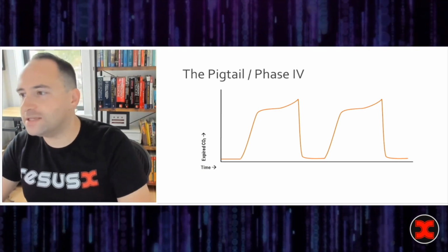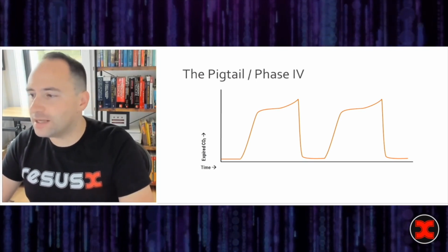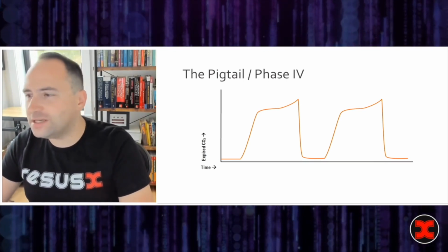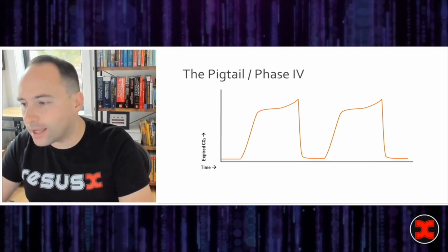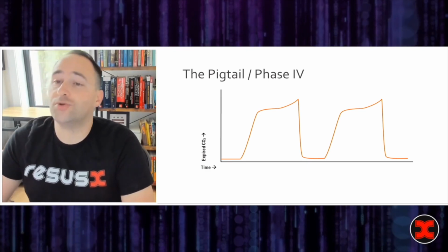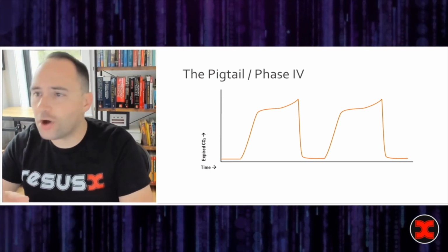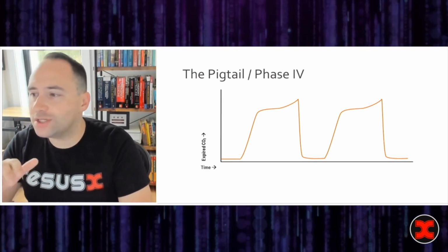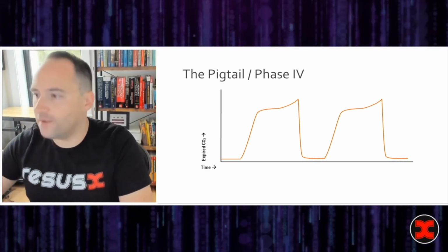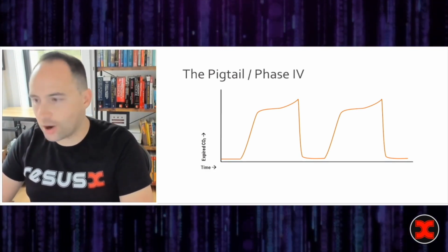All right, so this is called the pigtail, or what we talked about earlier as phase 4. So this capnogram represents this kind of upstroke, or this pinching of phase 4. And this is seen largely in states of really bad compliance. So you can think about patients with acute respiratory distress syndrome, but additionally think of extrathoracic causes of poor compliance, such as obesity or pregnancy. So the thought behind this physiology is that here there is sudden airway closure, and at the very end of exhalation, there's a sudden rush or squeeze of end-tidal CO2, causing a brief increase in the value. All right, next tracing.